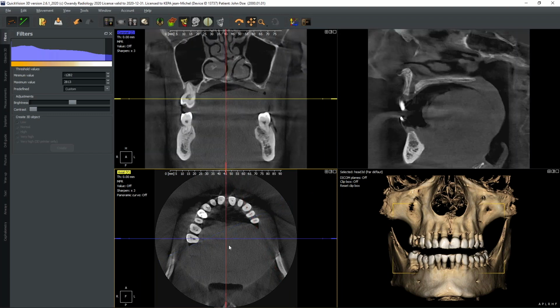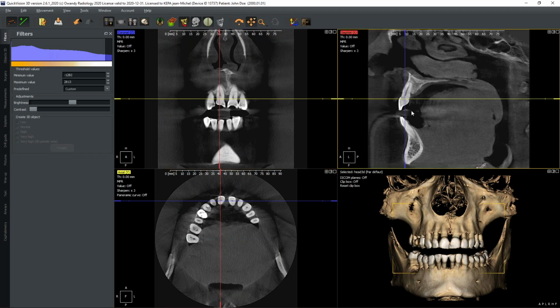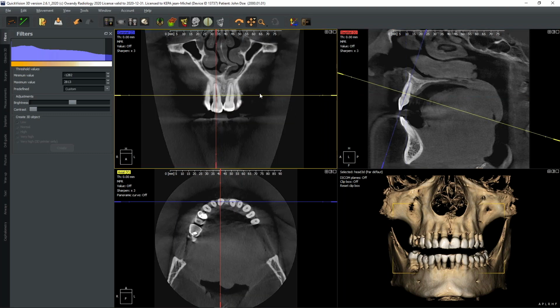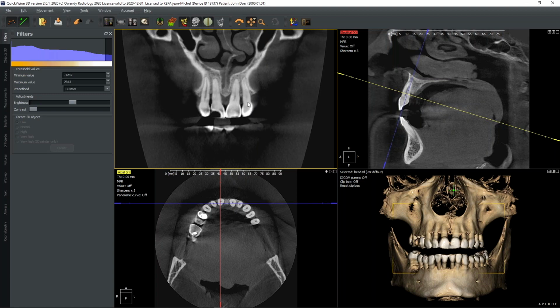So third step, we go on the incision area. I go just on top of number 1, and you see on the right side, I see the profile of my teeth. Number 1. I go in the middle of them, I align to them, and you see here on the left side, the coronal view, my number 1 and number 2 at once.